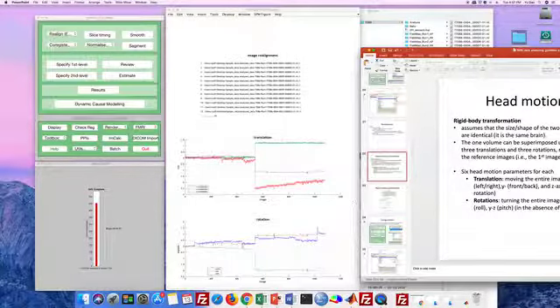So here we can see the first 540. The x-axis is the number of images. This is the first one, and then we have 1,060 in total. The first half is run 1, and this is run 2. And the y-axis is how far they moved.